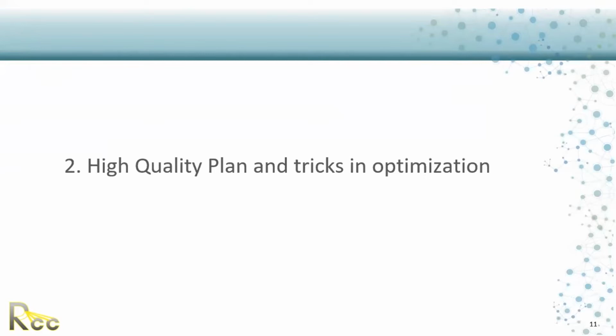If you do this, let's say your PTV is close to the surface and you push the optimizer too much to achieve the dose at that area, then you will have a hotspot, 120, 130, 125, something like this, and you will be struggling all the time. You are trying to reduce the hotspot, but it's not going down. Or the dose coverage will not really be conformal. You will see some areas that have very hot dose and other areas very cold.